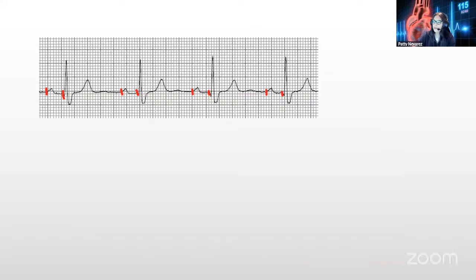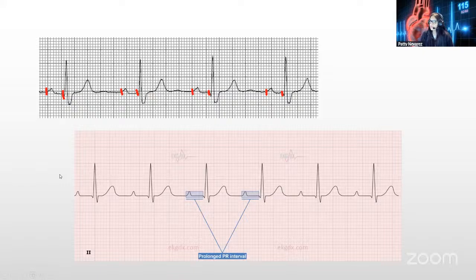Oh, there you go. I went a little too far. There you go. Let's take a look at another one. And you have to remember, every EKG is going to look different. Our patients are breathing, they're moving, there's artifact, there's all kinds of things, but there are certain elements that we should be able to recognize. Okay, so we're gonna start just like we started before.